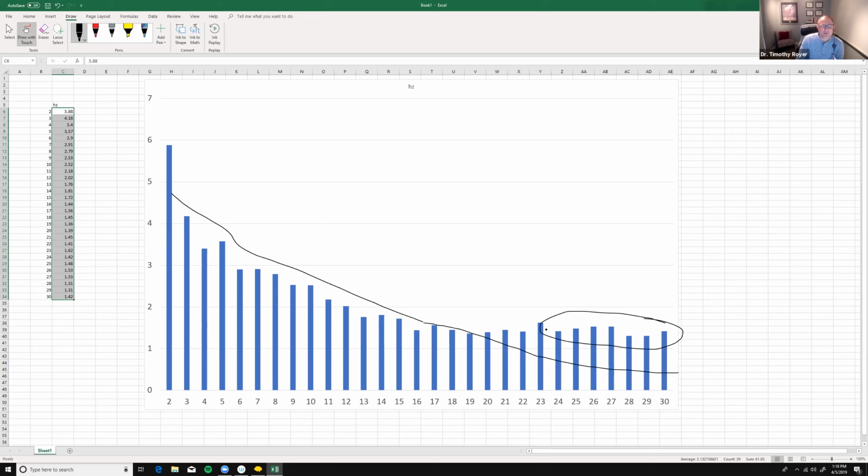So one of the questions is, what is the exact slope that I'm looking for? How do I find the ideal slope when I'm looking at the image, or at a 3D view? Well, we know a few things.